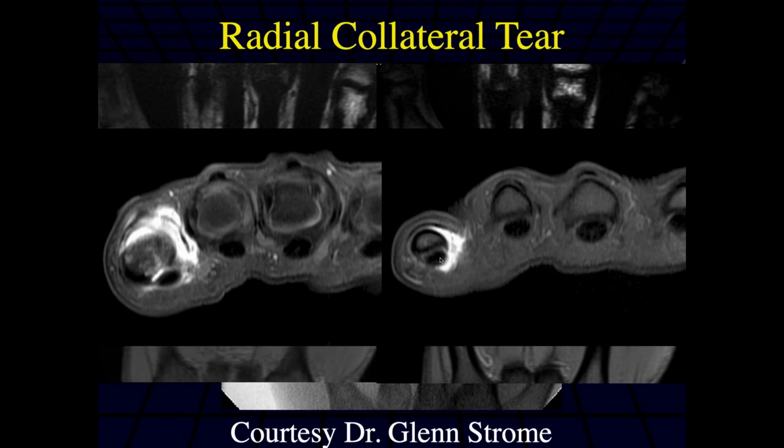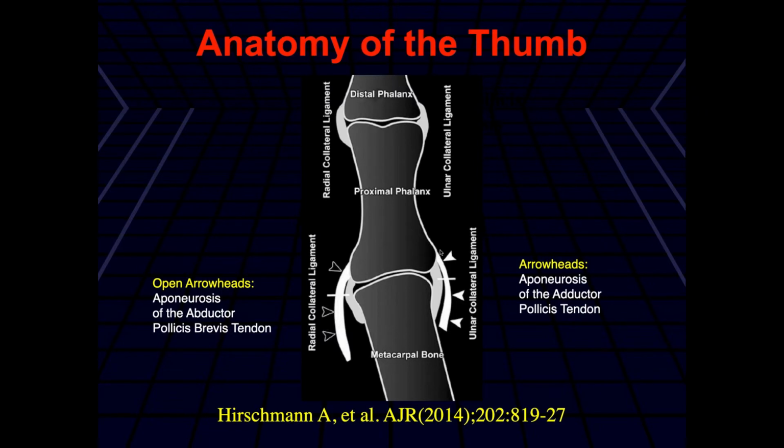Okay. So that was a radial collateral ligament tear. It looks torn to me. Yeah. And again, I think this healed without surgery. Most will, except you have to treat them right away. Okay. And that's the secret. And then treat them for a long period of time.